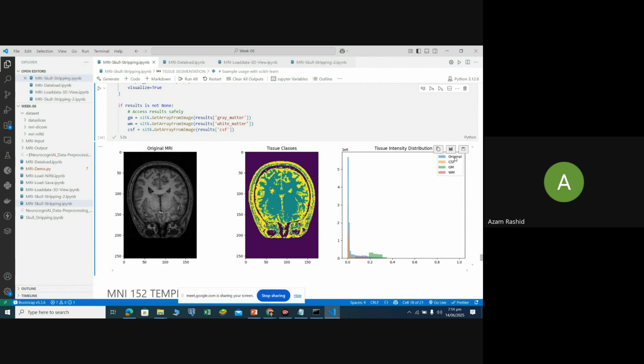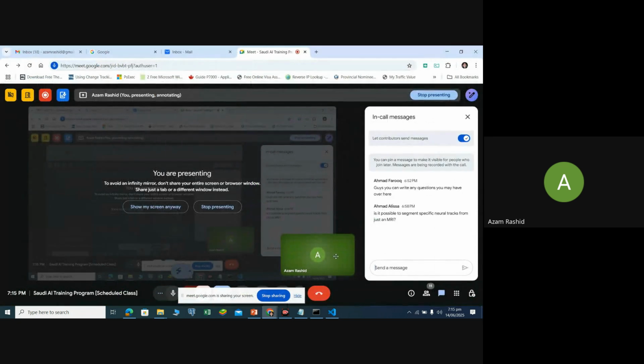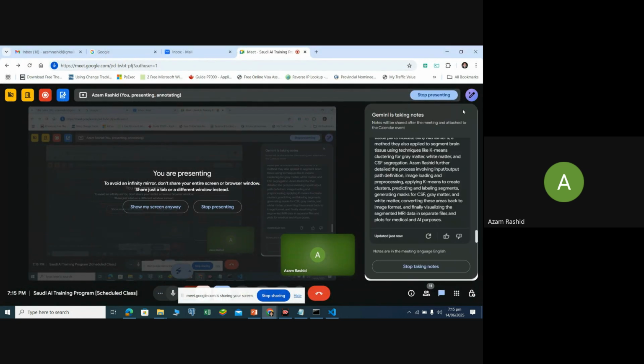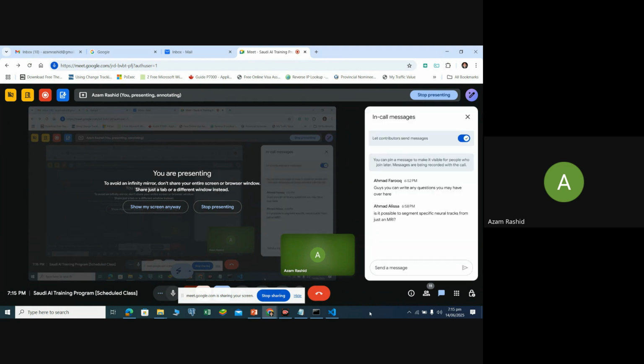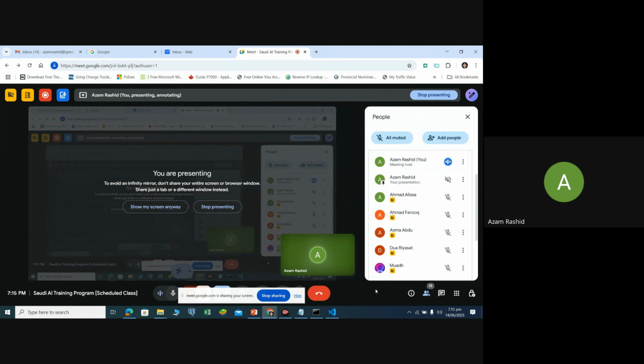This representation shows the original area in such an example, and the CSF area is that. These colorings are also in the color bar. Now, if somebody has a question, then we wind up the last step of today's lecture. If somebody has some question, please ask me.